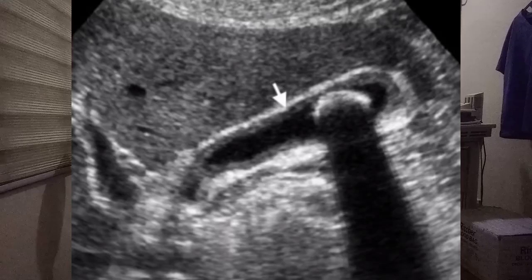Here is an image showing chronic cholecystitis. This image is of a 49-year-old woman with chronic cholecystitis. This patient had fasted overnight, so the wall thickening does not represent physiologic contraction. Correlation of these findings with her clinical history of recurrent colic-like right upper quadrant pain due to transient gallbladder obstruction is essential for the diagnosis. You can see the WES sign, the thickened wall, and the arrow showing the thickened wall.